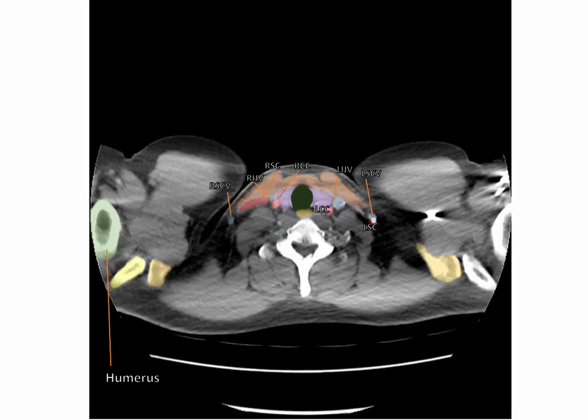We have now reached just above the level of the superior thoracic aperture, also known as the thoracic inlet, sometimes known clinically as the thoracic outlet. This is bounded by the T1 vertebrae, the first pair of ribs and their costal cartilages, and the manubrium of the sternum. A run-through of the same CT scan which we have examined will follow this presentation.